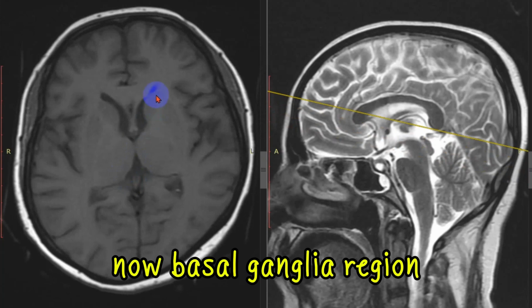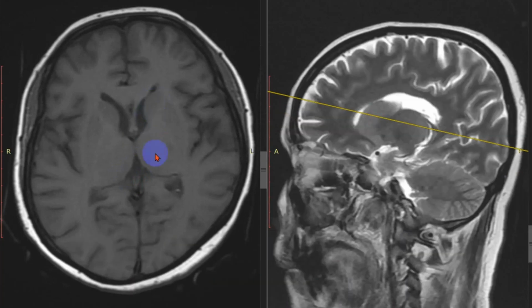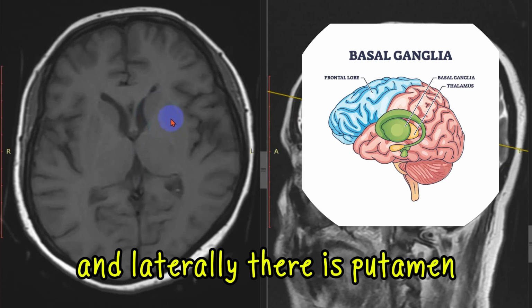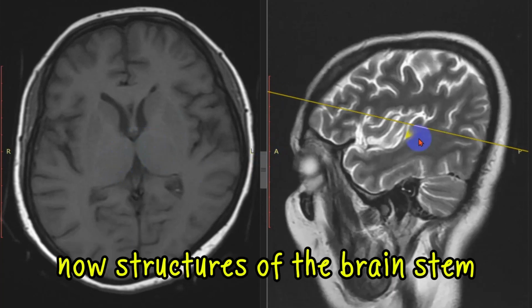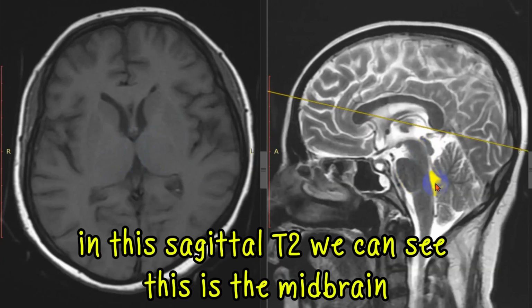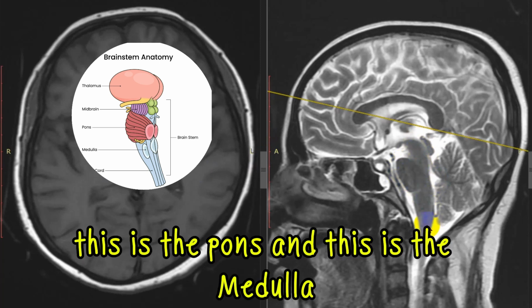Now the basal ganglia region. Here we can see this is the head of the caudate nucleus, and in this part there is the globus pallidus, and laterally there is the putamen, and the thalamus is located in this part. Here you can see this is the thalamus. Now structures of the brainstem. In this sagittal T2 we can see this is the midbrain, this is the pons, and this is the medulla.